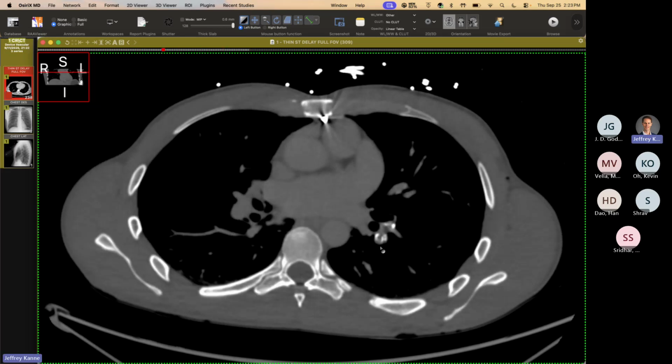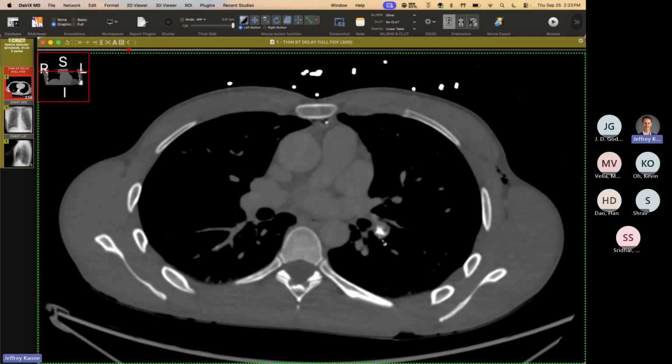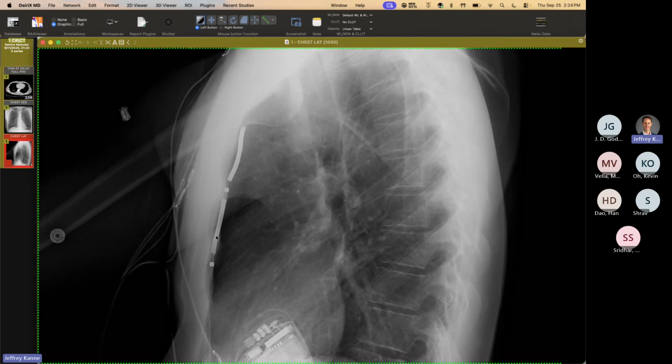And I was looking at these, and they don't even really look like thrombus. They look like just chunks of calcium. They look like calcified lymph nodes, but it hadn't eroded in from anywhere. So I was reading the procedure note for this extraction and replacement of the new pacemaker. Then you can see how they do the extravascular one here.